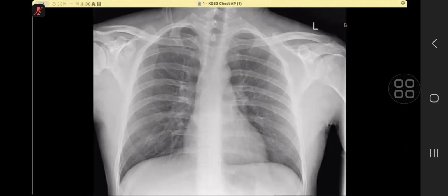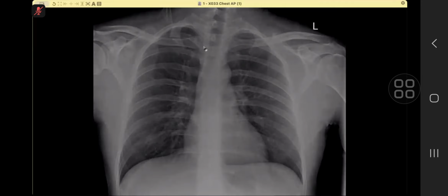The spine, there is no paraspinal soft tissue opacification. However, in my routine practice, I will slightly change the window and will look for any paraaortic region. And also, I will like to change the window slightly for you.